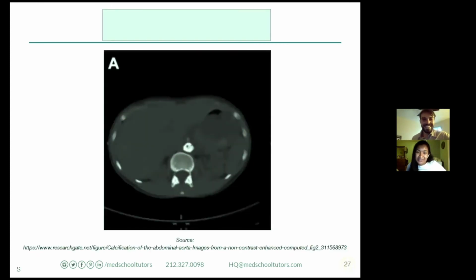Awesome. Okay, so here is my bone windows that I was just speaking of. While people take a look at this and see if you see anything weird, please feel free to throw your answers in. As I'm waiting, I'll just say, I cannot make out the liver here. This is, I guess, what the liver is, but you can tell that the window and leveling, the difference in the color scale here, makes it impossible to discern subtleties. Very difficult to discern what's going on here.